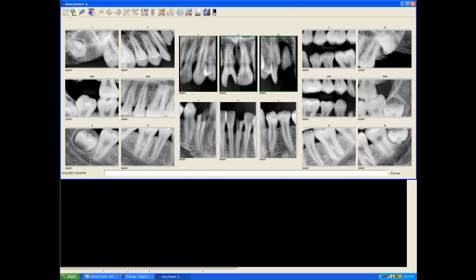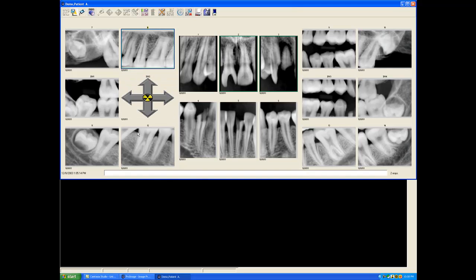So, as you can see, every single radiograph can have a comment added to it, and even if we have a stack, for instance, I'll take this and stack it on top of that one. I can now put a comment on here, A, and then that's the bottom, and then go to the top, select that, and go B. And when I bring this one up, I have A, and this one, and select it, I have B. So it'll even follow the teeth within a stack. No problem.